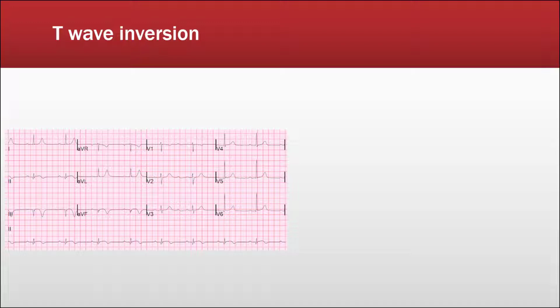So in adults, the T wave should be upright. That is to say, it should be positive in lead 1, 2, and between leads V3 and V6. Now, while inversion in the other leads might be expected, leads 3, V1 and aVR are more likely to have inverted T waves under normal circumstances. So what we would be worried about is the presence of inverted T waves in the leads where we would normally expect them to be positive.